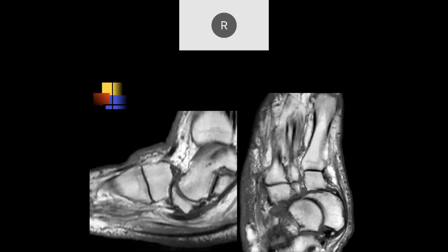All right. Let's see. Well, it looks like the navicular bone is not appropriately articulating with the cuneiform there. So is this a dislocation? Yeah, this is an old dislocation, and you can see a lot of instability. The navicular is markedly medially displaced and rotated. It's about as flat a foot as you're going to get. It almost looks like a congenital vertical talus.